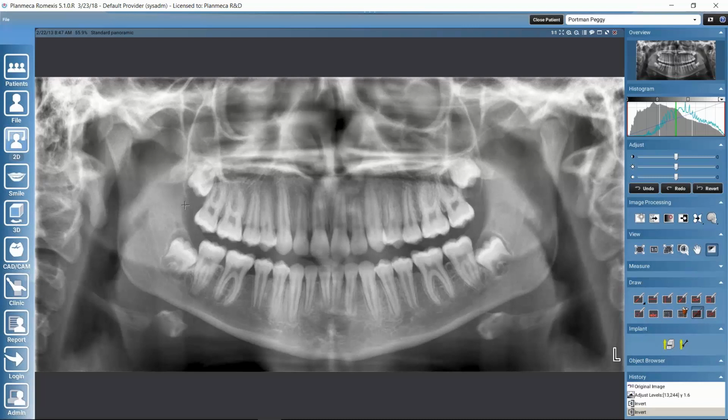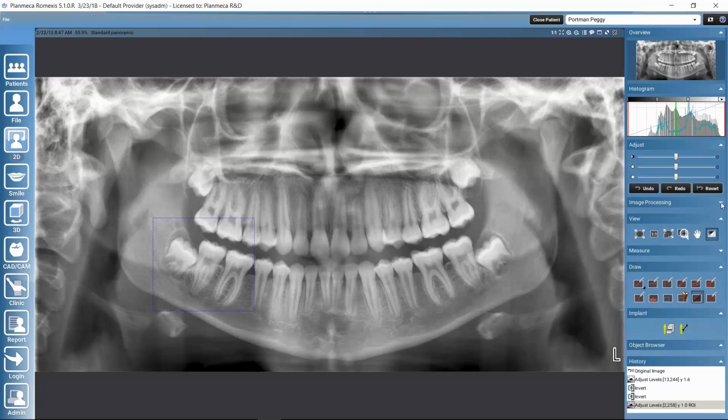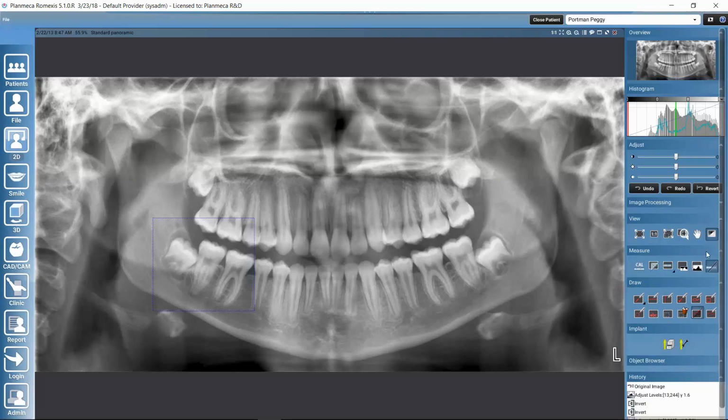And then if we would like to adjust only a specific area of the image, we could activate this last button, region of interest, and by keeping the mouse left button down, we could draw a rectangle here. And now if we make image adjustments, they would only get applied on that specific area. Then if we want to process our image, we can make measurements.